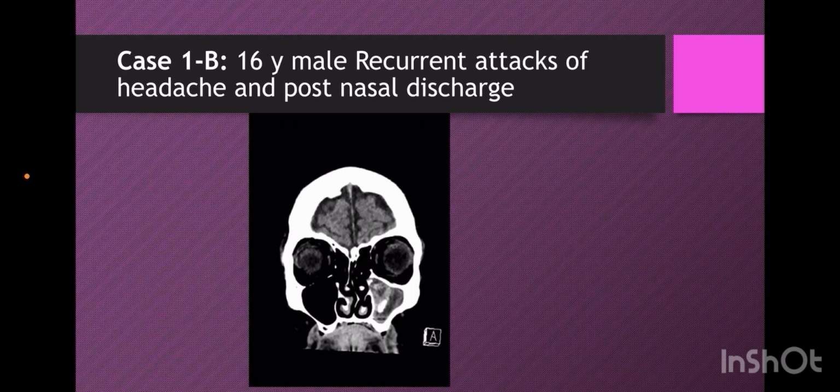Okay, let's go to the second case, part B. In case 1, part B, a 16-year-old male with recurrent attacks of headache and postnasal discharge. In this coronal CT scan image, you see opacification of the left maxillary sinus that contains central calcifications.